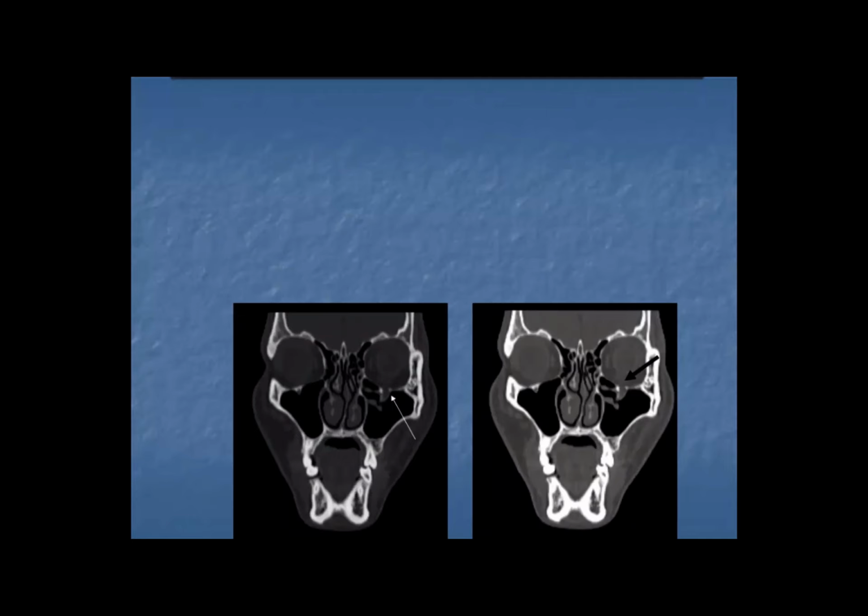The facial fractures. CT is the imaging study of choice for evaluation of facial fractures. Multi-slice scanners allow reconstruction in the coronal plane, so the patient does not have to be repositioned in the scanner. The most common orbital fracture is the blowout fracture, which is produced by direct impact on the orbit.